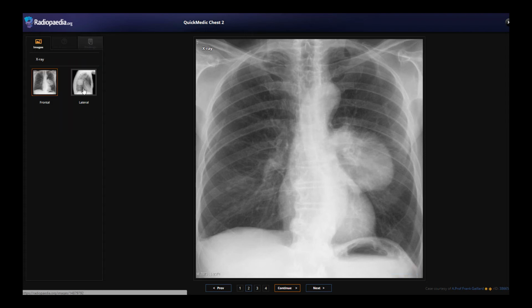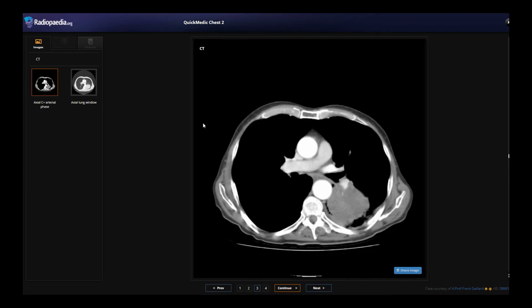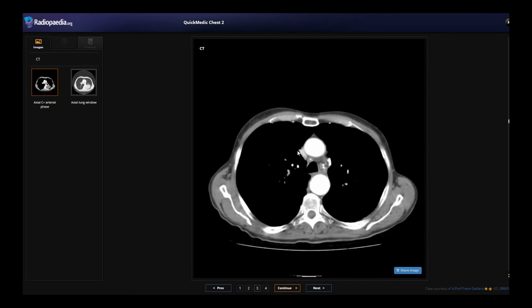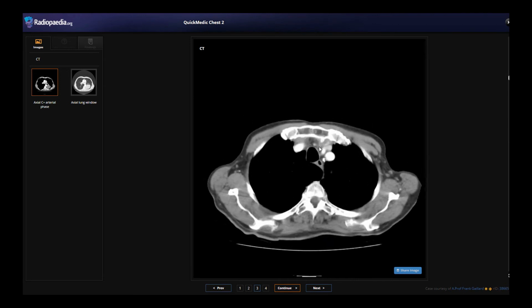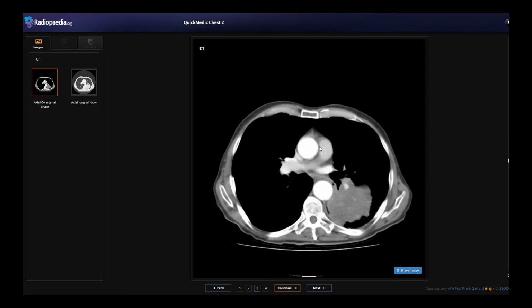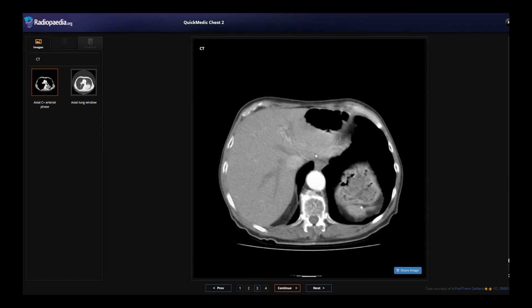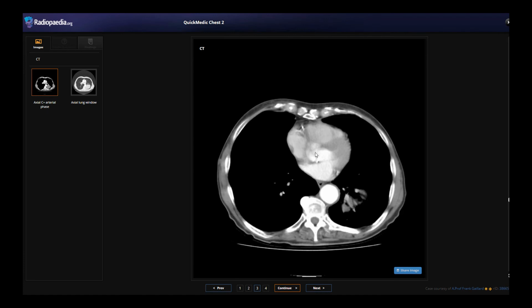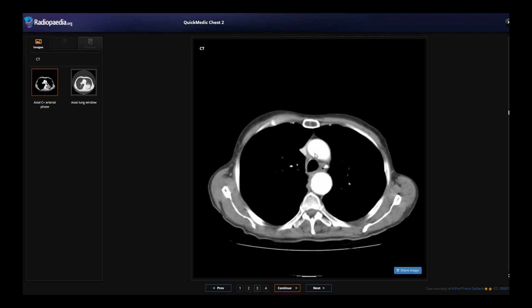And indeed, the author says that this is confirmed when you look at the radiograph, because you can see the heart here, and this is obviously behind. And helpfully, he's gone on to provide an axial arterial phase CT scan for this. So if we go to the very top and work our way down, this is an arterial phase, so we'll only see the arterial phase, but we can start to see something nasty coming into shape. That should all be black because your diaphragm's here, and if we work our way up towards the head, that's the heart, lung. Oh, there's something nasty in there. That looks pretty solid and nasty.